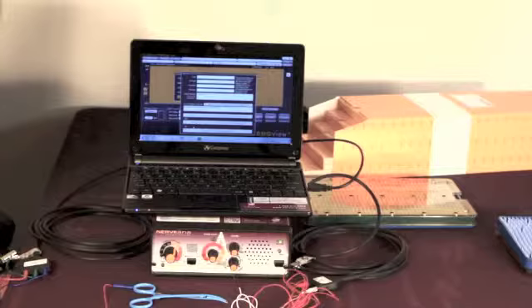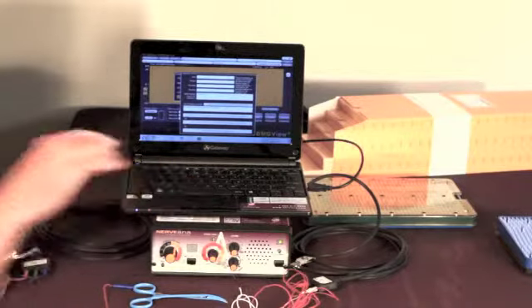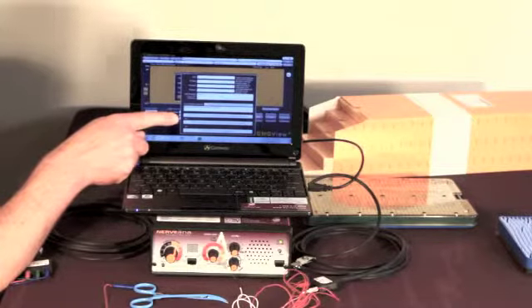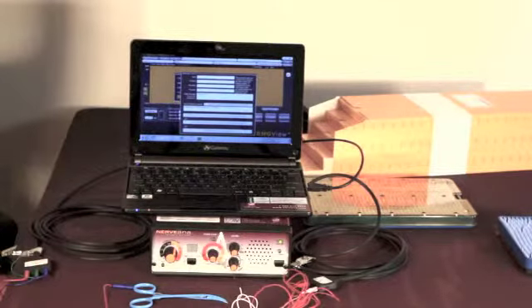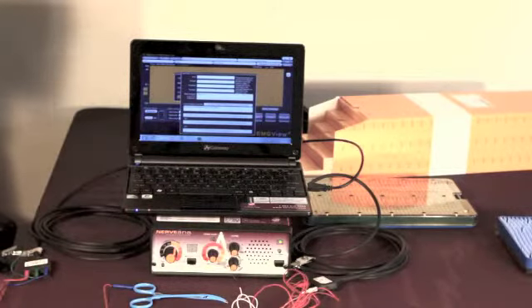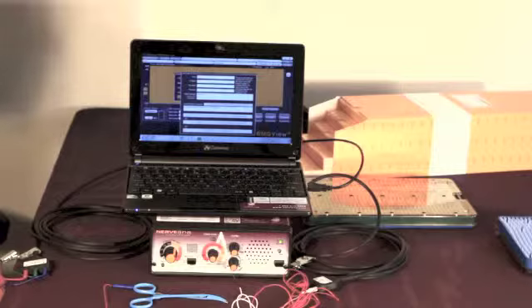You're next presented with this menu, which gives you three options. You can either start the case and record the information, you can start the case and monitor without recording any information, or you could play back a file that was recorded previously. EMGView allows you to capture and record on your PC all of the data that was captured by the Nerveäna during the surgery.